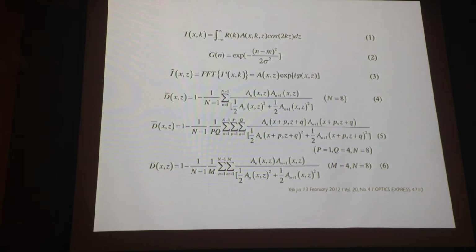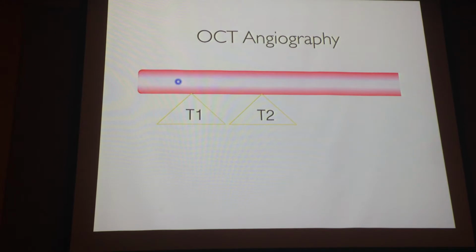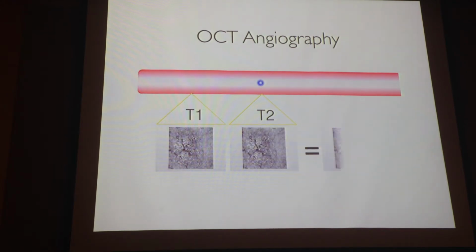Actually, just to understand, it's the algorithm that changes the OCT angio from the normal OCT that we are used to working with. Of course, I don't understand anything from that. But the thing that I understood was that you have 2 time points, time 1 and time 2. Anything moving in the vessels gives an image if it's acquired in time 1 and time 2.